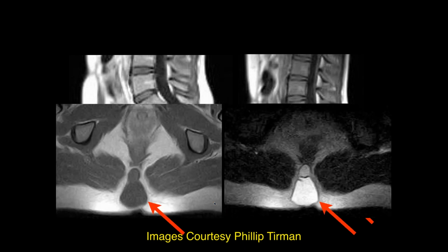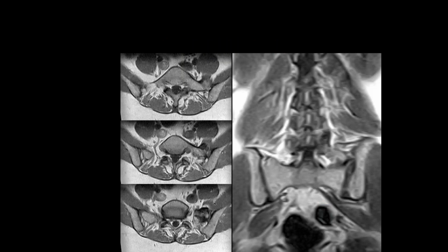This one turned out to be a pilonidal cyst, which is more of a skin lesion rather than a neural lesion. Okay. They're difficult to treat. You can't cut deep enough to get rid of all the hair and stuff. They're filled with all kinds of tissue, but mostly it's hair, and you see this in people that are quite hairy.